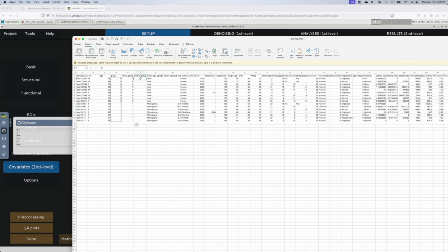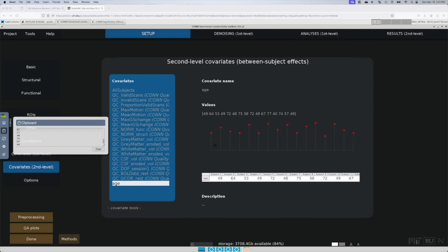And what is control group? It's the opposite. So I could do a little if-then statement, but I'm just going to type it in like that because there's not very many. And so those are group variables, and you really want to set it up so that one group has a 1, and then you have another variable where the other group has a 1, and kind of vice versa. So now we're going to add those group variables. So I'm going to add these 3 variables.